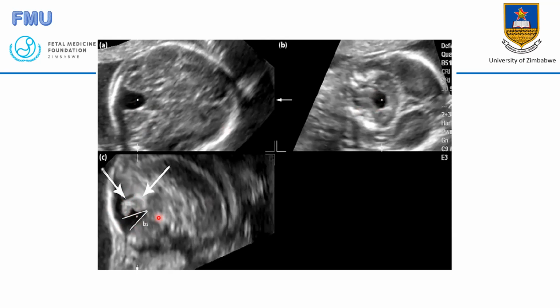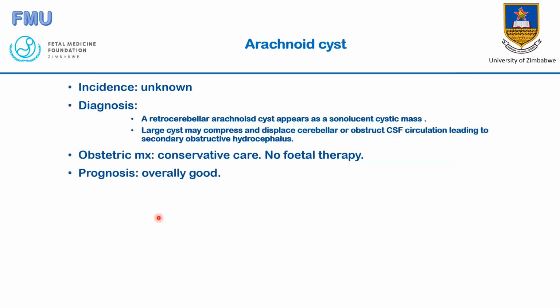So it's not totally absent, but it is smaller than what it should be. There are fewer fibers than there should be, like in the case of partial agenesis of the corpus callosum.